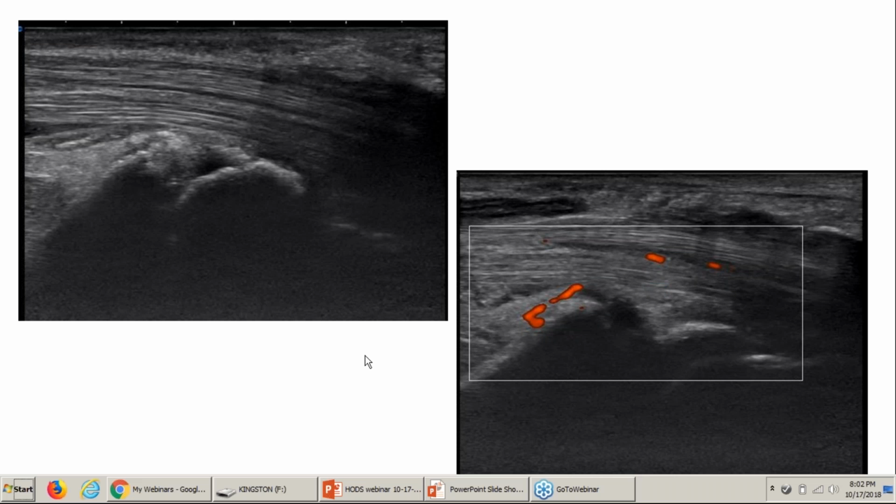Okay. Yeah, but I wouldn't say thickening and fibrosis, because if you just look at this B mode image and nothing else, the tendons are looking okay. They're not looking that bad, right? But the joint is definitely abnormal. So I would say there are cortical irregularities and evidence of early joint erosion. You can also say early mild changes of erosion, and there is a positive color Doppler sign which suggests vascularity, so it's suggestive of synovitis or synovial inflammation.